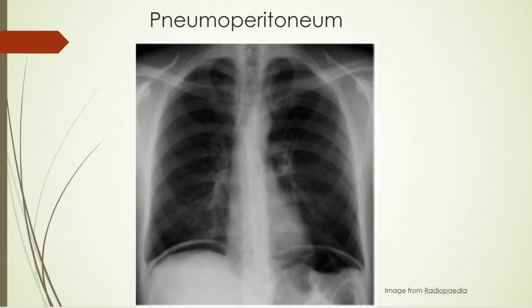This is a pneumoperitoneum, and you can see the diaphragm here, and air under the diaphragm. This is air, and here is the diaphragm, and this is all air. This is liver, and this, of course, is stomach over here. These are gastric bubbles, but this is all air from the pneumoperitoneum. So this guy needs to find a general surgeon to fix him.